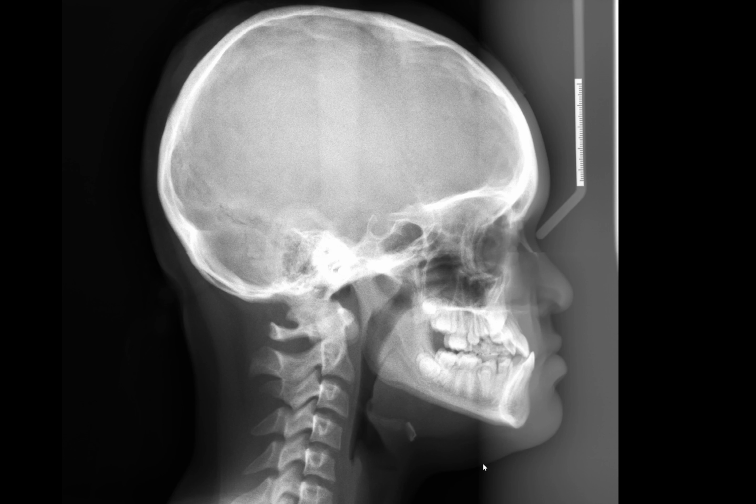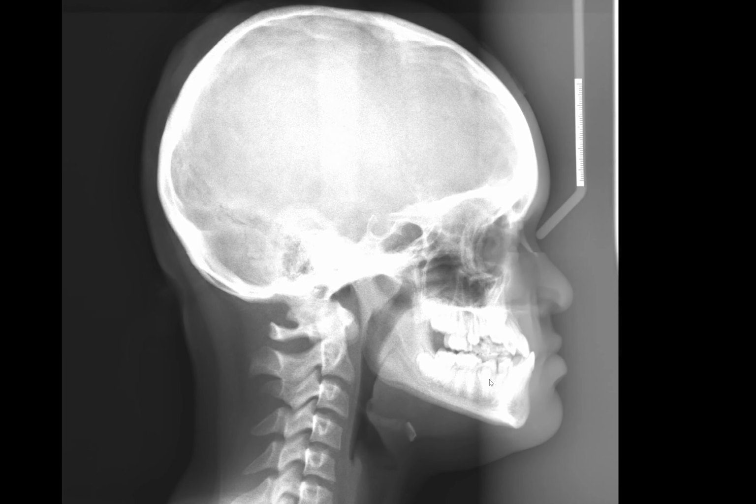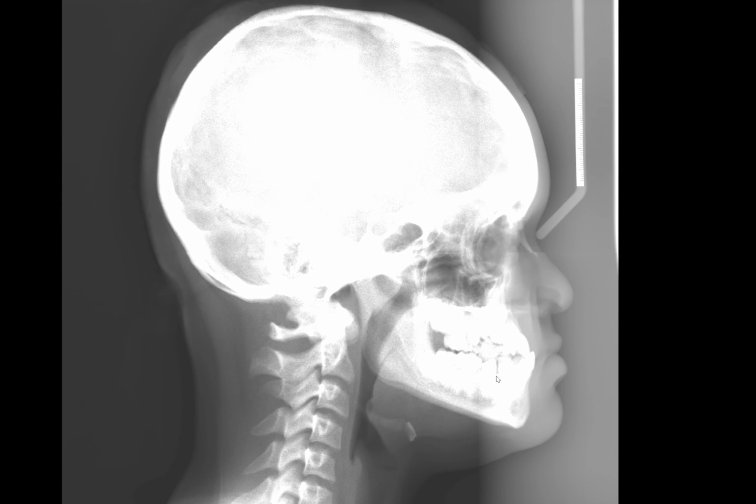Anything to the left side, you start to lose the soft tissue outline. It's just not as well visualized. Yes, we can see it, but not as clearly as the patient's front of the face. Let me try to adjust it, lower the contrast to bring out this soft tissue outline as best as I can. Even then, this outline is definitely more clear and sharp. And there's a distinct line that comes down that affects this area.